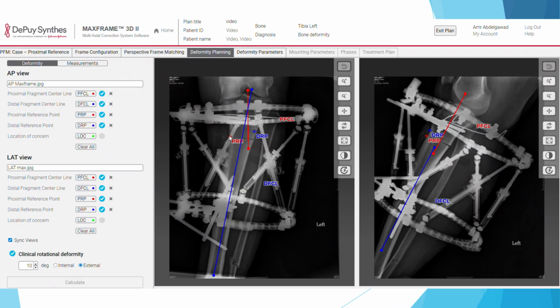So let's see, I have here the dots, let's go proximal, and here proximal, and then the distal here. So if we bring the distal here, and then you bring it here so that they are in the same line.